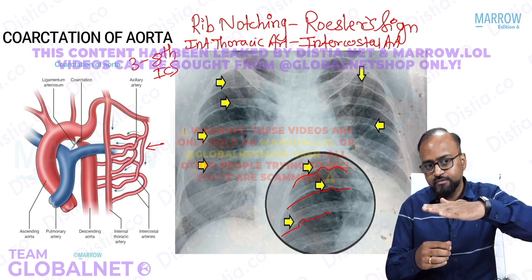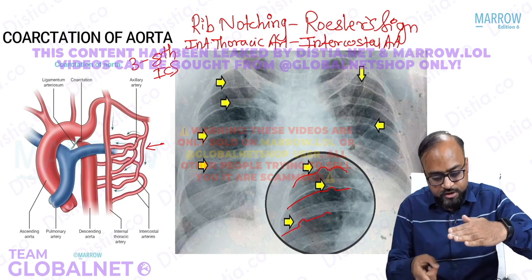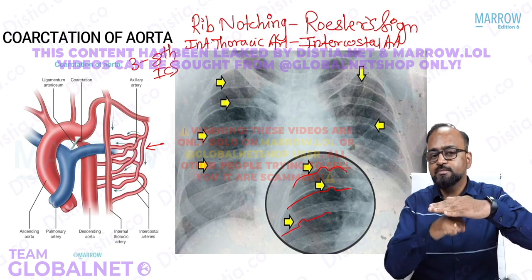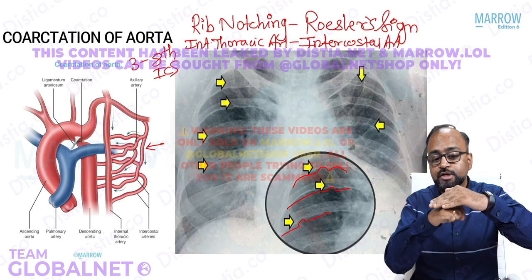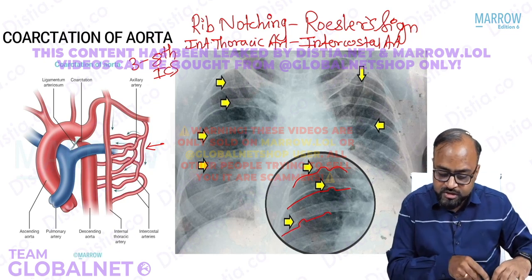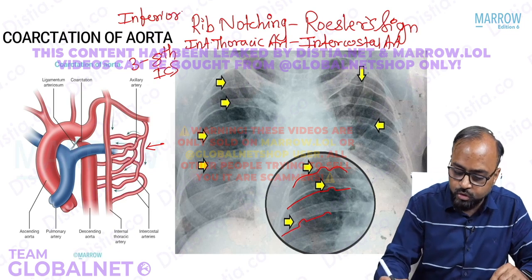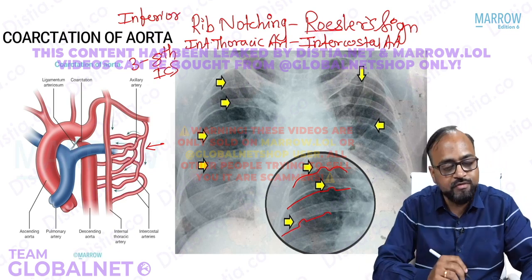If this is the rib, the inferior margin of the rib, along which there is the intercostal groove in which the intercostal artery is running, this enlarged intercostal artery's pulsations are transmitted onto the inferior margin of the rib, which eventually undergoes remodeling, and that is where this notch is created. So this is inferior rib notching, or Roessler's sign, seen because of collateral channels in coarctation of aorta.